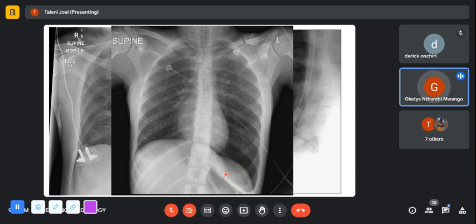It's like an inversion. And if you have a lateral view, it's where you'd see that everted or concave diaphragm. And you tend to see that as well in pediatrics where you have air trapping. You can actually have the diaphragm having this kind of shape, but it will not be double. Okay?